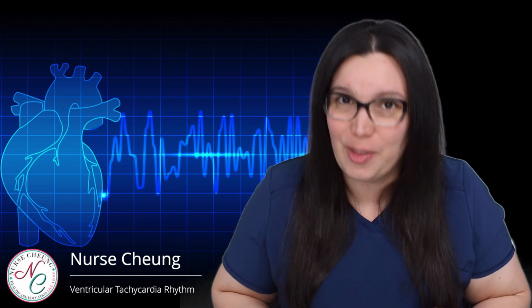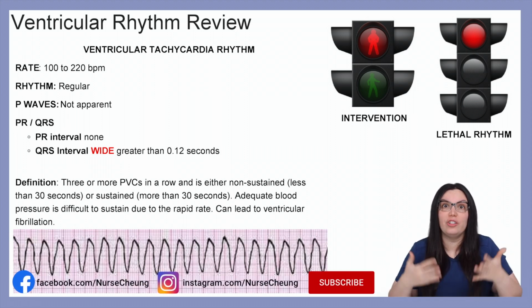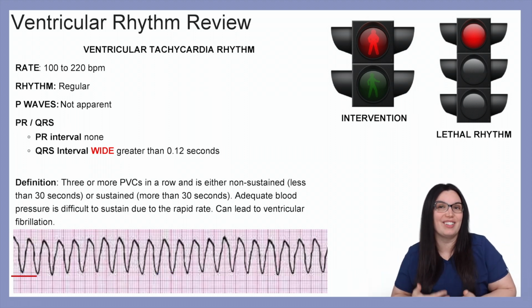Today we are continuing on with our cardiovascular assessment and electrocardiogram like a boss series, and we're going to start looking at our potentially lethal rhythms, also known as our ventricular rhythms. So to begin, we're going to be looking at our first potentially lethal rhythm, ventricular tachycardia.